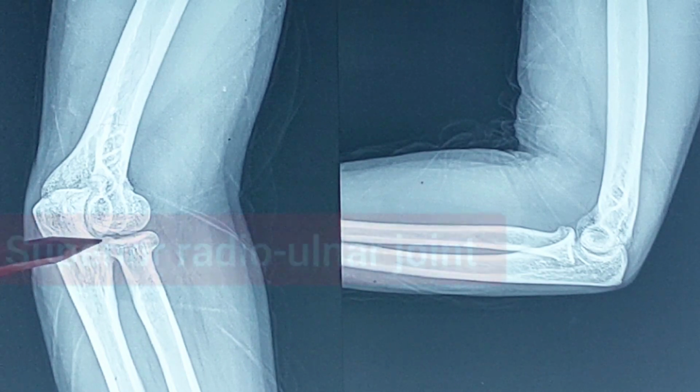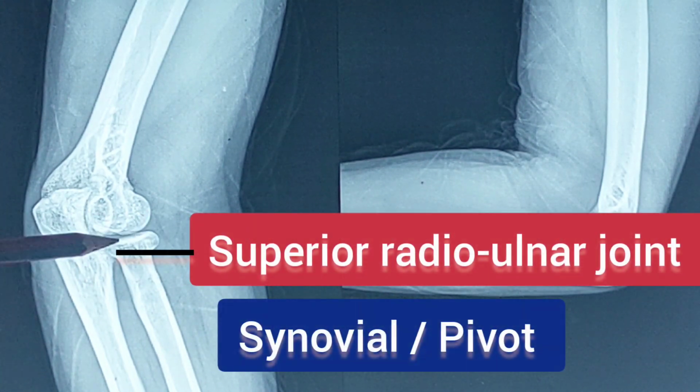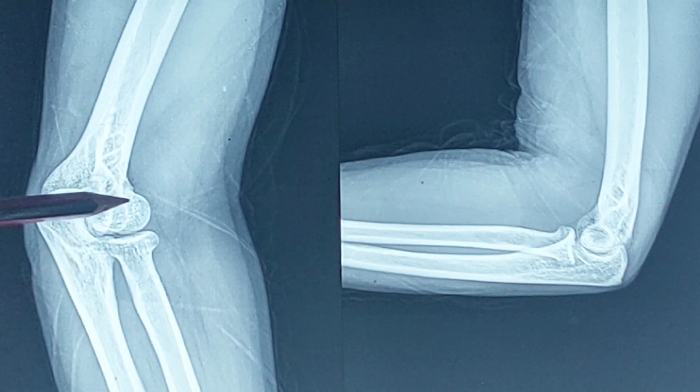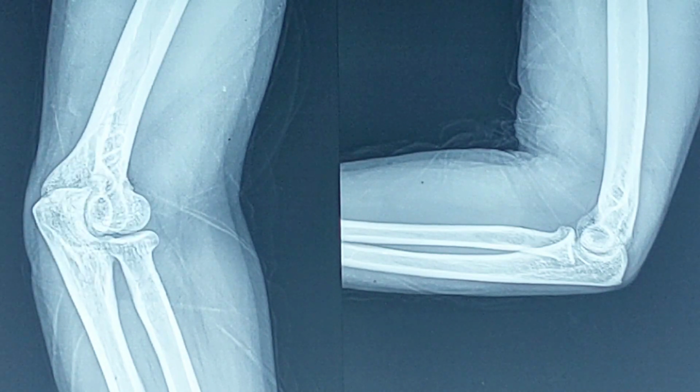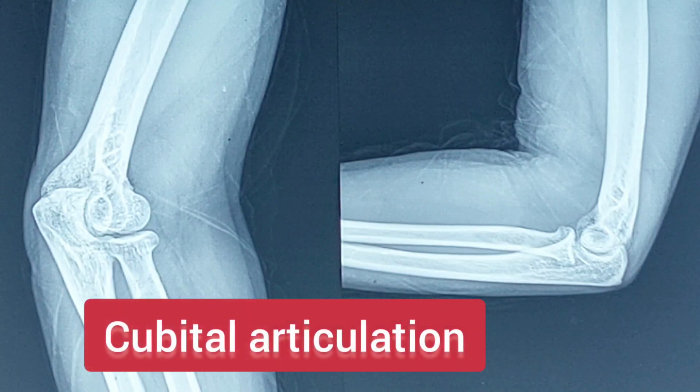This joint is called the superior radioulnar joint, which is formed by the radial head and the radial notch of the ulna. So this joint, along with the humeroulnar and humeroradial joints, all these three joints are enveloped by a common synovial covering called the cubital articulation.